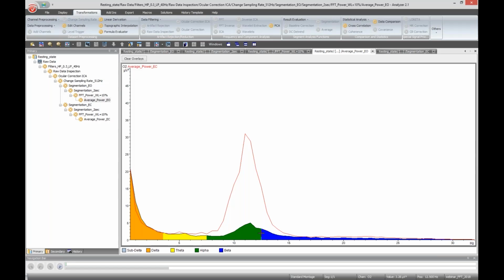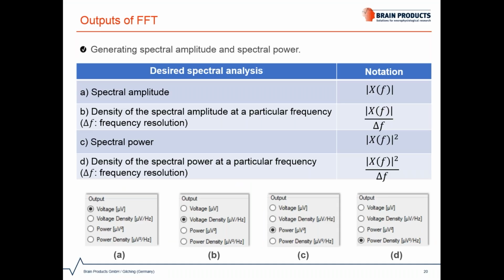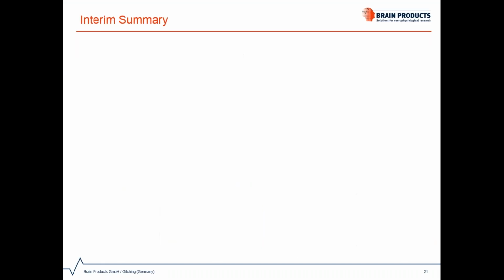So you can apply this nice overlay feature to compare and contrast results between subjects or between conditions. So with this, I will end the demo session. Let me briefly go back to the slides and summarize what we have learned so far.